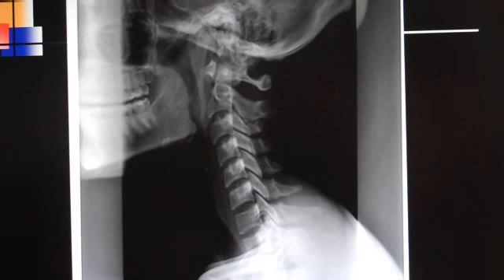And lateral masses are really weird just because they have not well-defined edges, and if you look at an atlas again, you'll see that all the edges are kind of scooped out and kind of fade to nothing, and that's because it's not a square box like a lot of people want it to be.